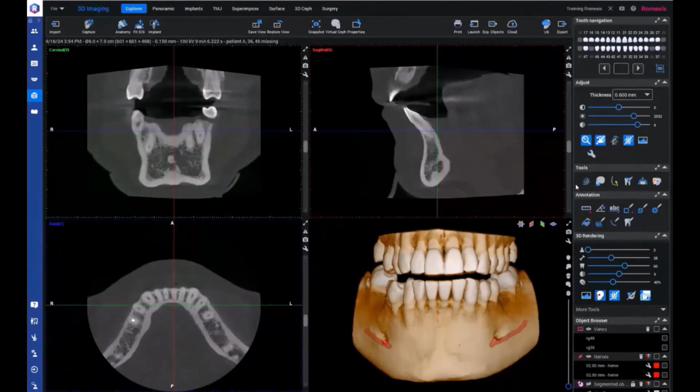First of all, maybe the first thing that you want to do is the adjustment of the volume if needed, and then of course different kinds of measurement and segmentation tools. And when we get the new image here, if we need to adjust any contrast and brightness, those can be found on this toolbar.